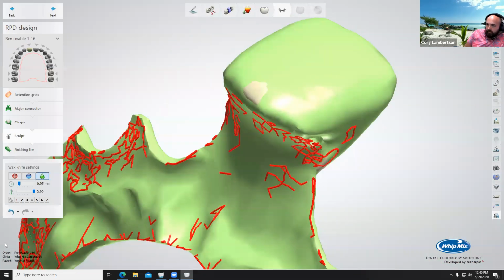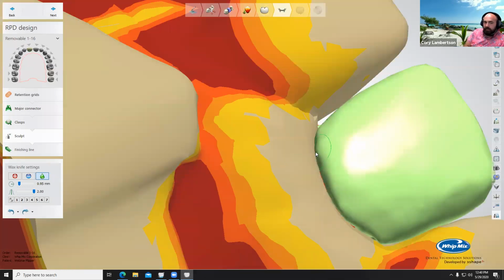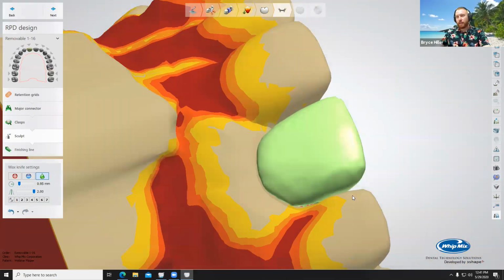It's amazing how those little tiny meshes, the way they remesh, how much it drives people nuts. So I saw you just click on that little hole that it created. Oh yeah, I can't deal with it. Can't do it.